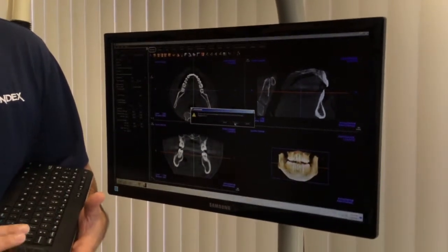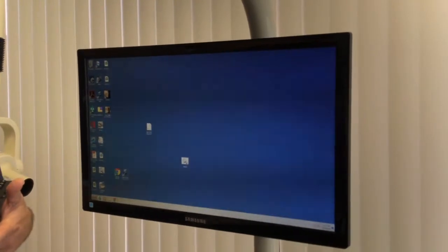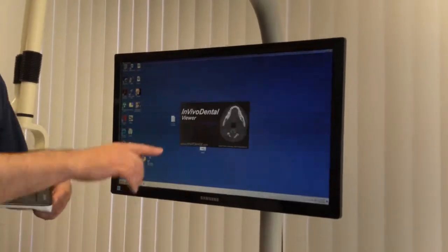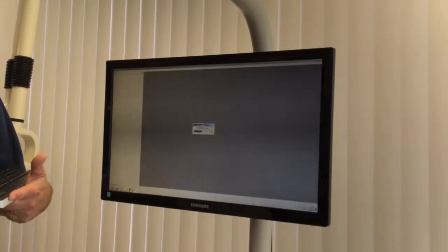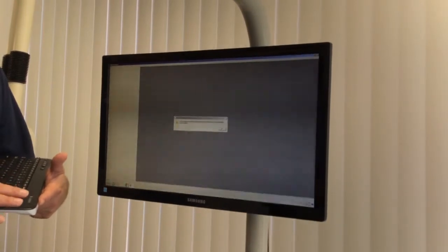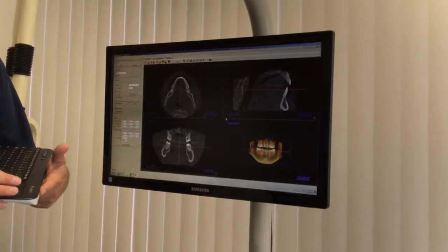And we'll close this file. And we'll discard. Okay. So now here, this is what the executable looks like. It lists the patient name. I double click on it. In vivo viewer, so it's not the full software. There's a couple of things, like the airway, I don't believe you can view in the viewer.